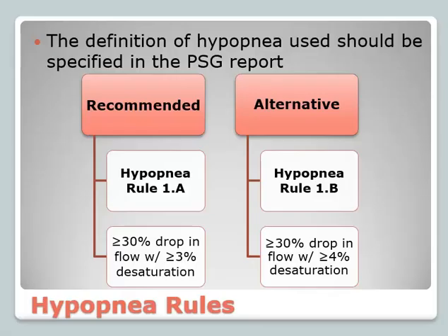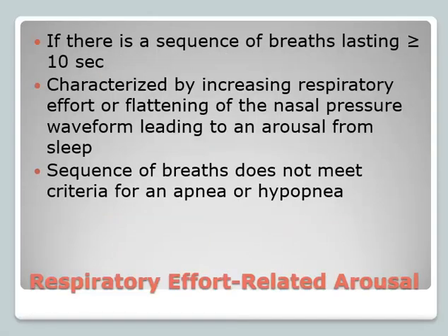Just 4%. RERA, respiratory effort related arousal. So basically what happened is, if you guys remember, as part of the AHI, you're looking at the overall number of apneas and hypopneas. That's what they used to go by to diagnose a patient with having OSA.